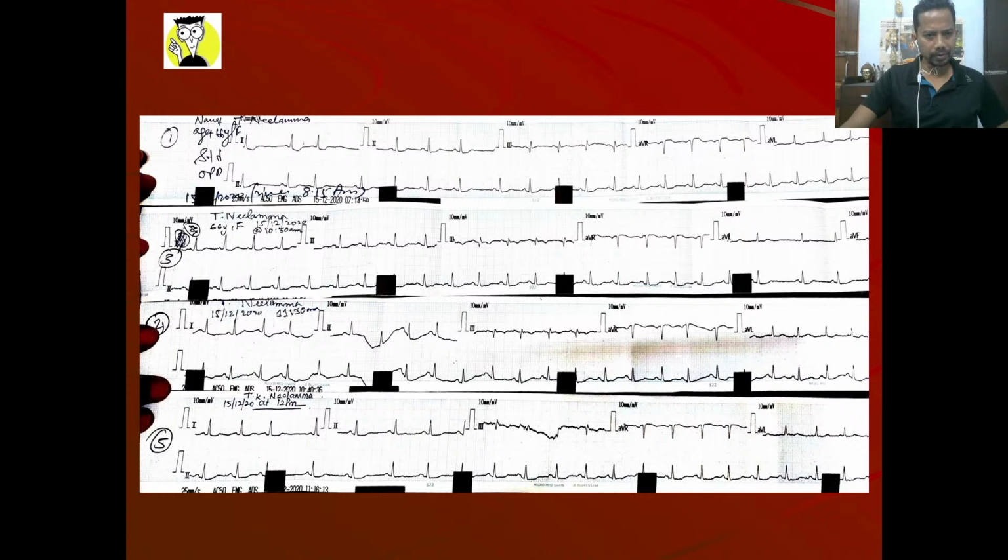So this is the patient's ECG, a patient we have right now also, who was admitted by another doctor. I think the JR had admitted, and he said, sir, the patient has ischemic changes, has come with ischemia, so we have admitted as ischemia, so please see the patient. And we were on call, so we saw the patient. Okay, so this is the first ECG. I saw this ECG. I said this is inferior wall MI with posterior wall MI, and we should thrombolyse.